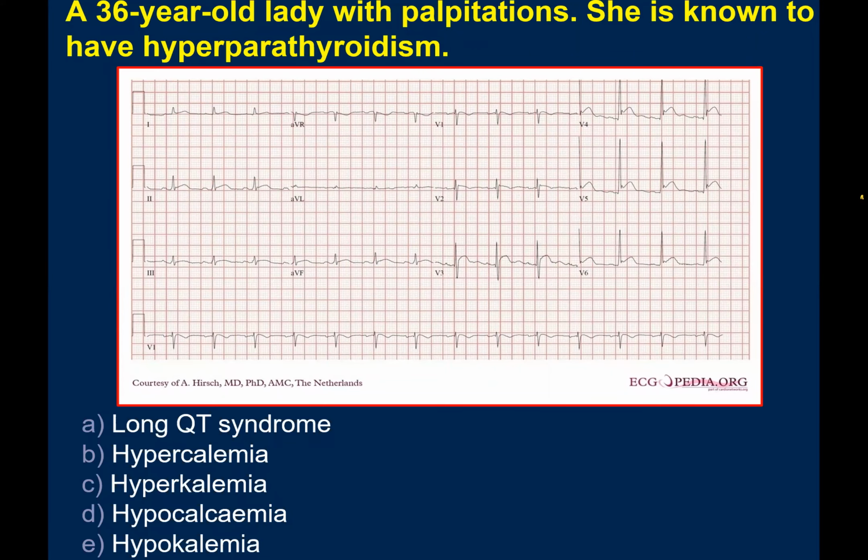The ECG overall has a low voltage, maybe in the limb leads, but the chest leads are okay there. You see, it's more than 10. Generally, we look for 5 in limb leads and more than 10 in chest leads, and this is more than 10. Yeah, there is also ST abnormality in V3. In lead 3 and V3. V3, yeah. And 4, 5, yeah.